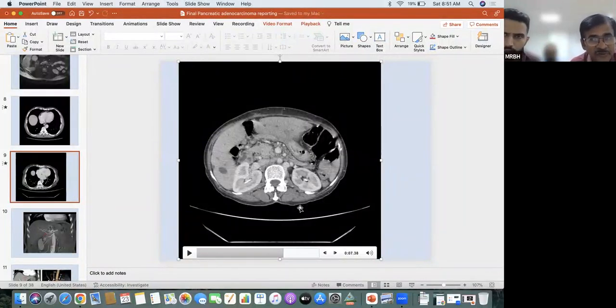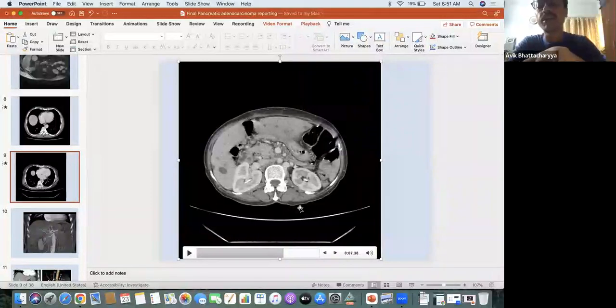There are a lot of things to look for. Those videos that I have shown are very characteristic: dilated common bile duct, dilated pancreatic duct, pancreatic head mass. You need to see if there is a head mass. First, you don't bother about the pancreatic duct being dilated or the CBD being dilated. First, you see whether the adjacent critical vascular structures are free or not.